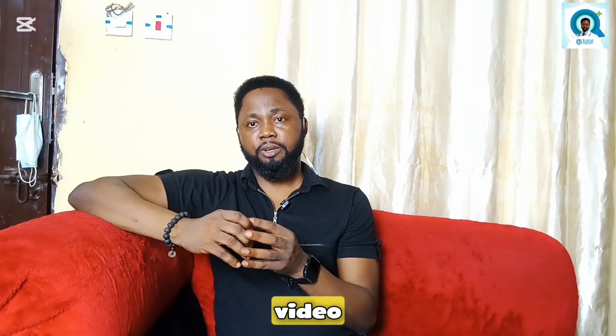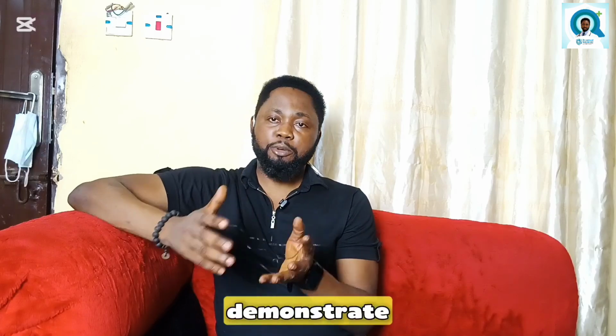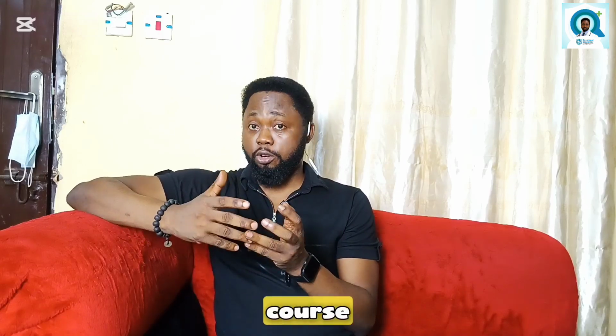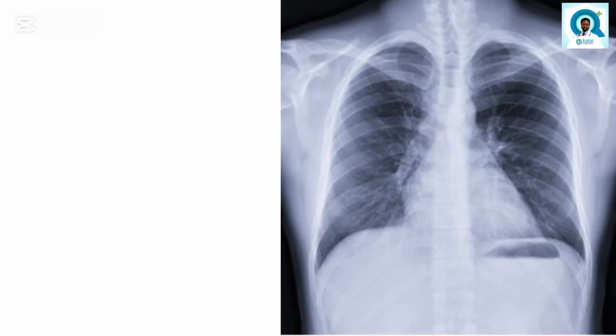And in this video, I'm going to use a hypothetical patient's x-ray to demonstrate how to report a normal chest x-ray using the ABCDE approach. Of course, we're going to assume that the image quality is adequate. So if you're ready, let's go.